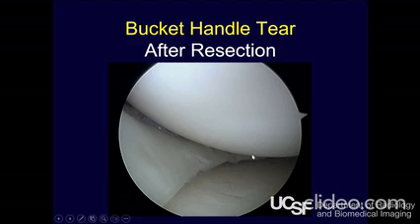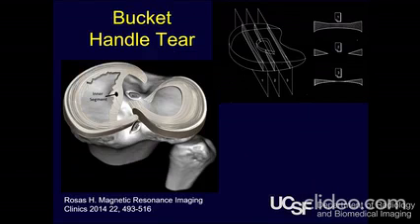Now, some of our surgeons are actually trying to preserve the meniscus these days, and if we get a bucket handle, they actually sew it back if that fragment isn't too messed up and the meniscus itself looks pretty good. So there are various ways to treat these. And this is what it looks like. They can be like a bucket with a handle, or they can be broken bucket handles where it's not completely a ring. So you may see tears in the bucket handle besides the handle going off.